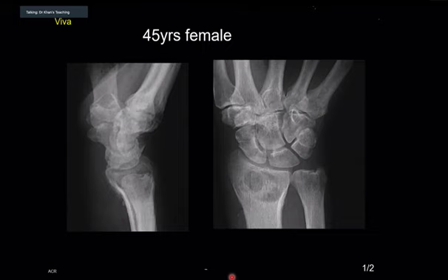What kind of primary bone tumor? Less likely, but METs, lymphoma, and infection. Is there any primary bone tumor which can give you this kind of appearance? No, so I take that back. I don't think it's a primary. If it was a child, I'd be thinking about a primary bone tumor, but the periosteal reaction is only on the lateral, and on the frontal, I don't think it looks more like one.